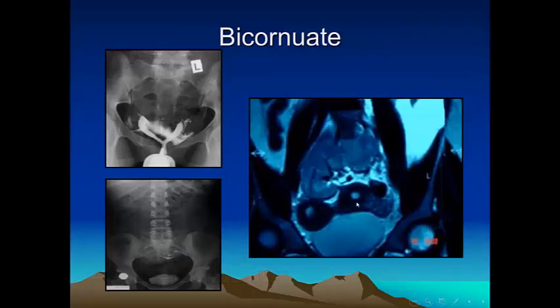So this is a pelvic kidney, and this is one of the associated findings that we can see. Very important: when you ask for MRI for a case considered to be a congenital uterine anomaly, please ask for T1 and T2 of the abdomen in order to have a look at the urinary system and the kidneys.